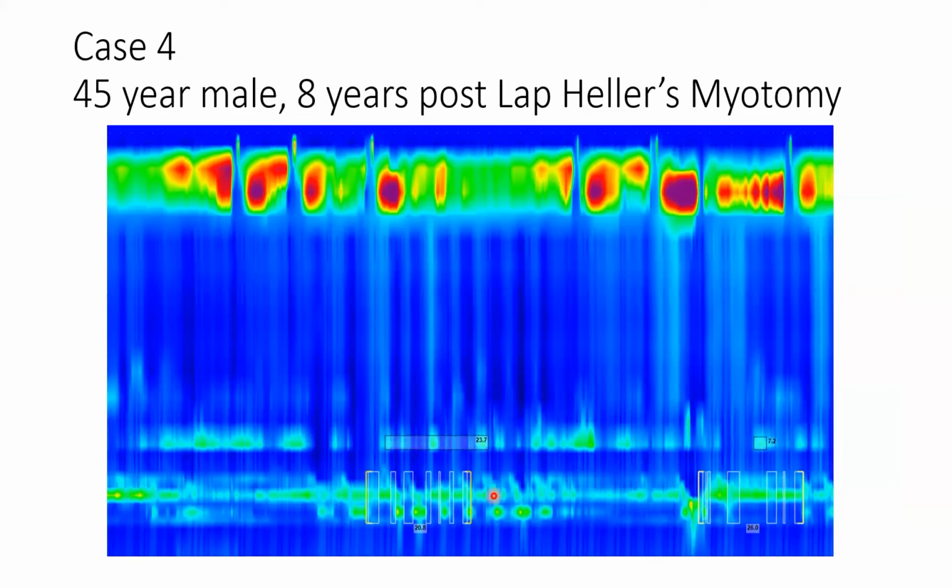manometry. As I said, the LES is not a problem, although you can still see an IRP in some of these findings of around 20.8, but these are artifacts because all the fluid is accumulating in the lower part of the esophagus, and endoscopically there is hardly any resistance. So these patients will not do very well on a redo POEM at all.